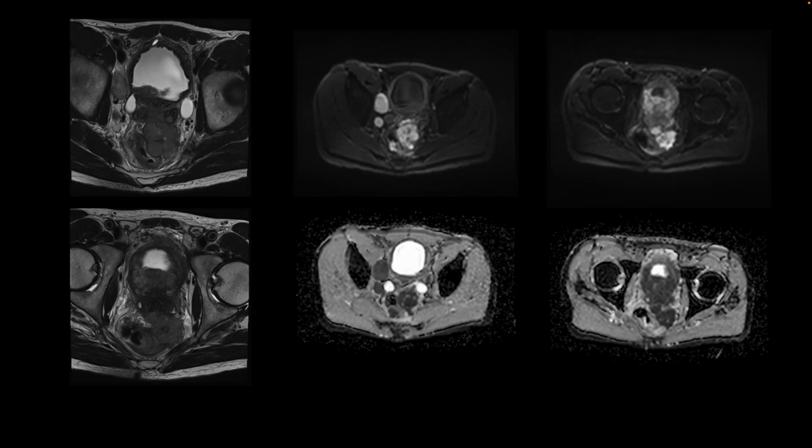So on this axial T2 weighted image, we see urine with high T2 signal. We see hydroureter on the left and on the right side, and we see the tumor occluding the UVJ on the right side. Here is the locally advanced tumor that is going beyond the prostate to involve the rectum. At another level, more inferiorly, we find that that's the tumor. And here it's trying to grow into and involve the wall of the urinary bladder.